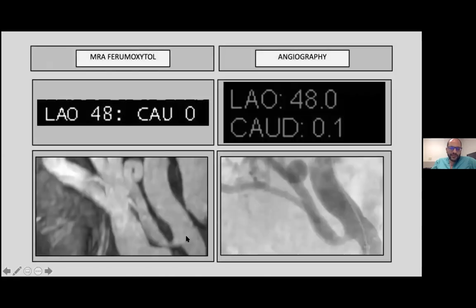Okay, here's an example of another use of it. The interventional radiologist asks us to give table positioning based off of the 3D reconstruction, which we're able to do. That way, when they shoot dye into the external iliac artery, they know that they're going to be able to see it the first time that they inject contrast, and they're able to see the stenosis optimally.